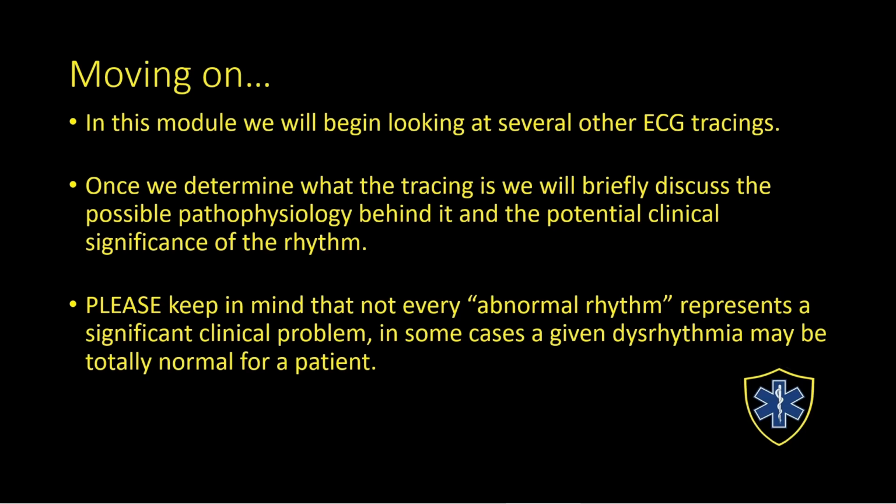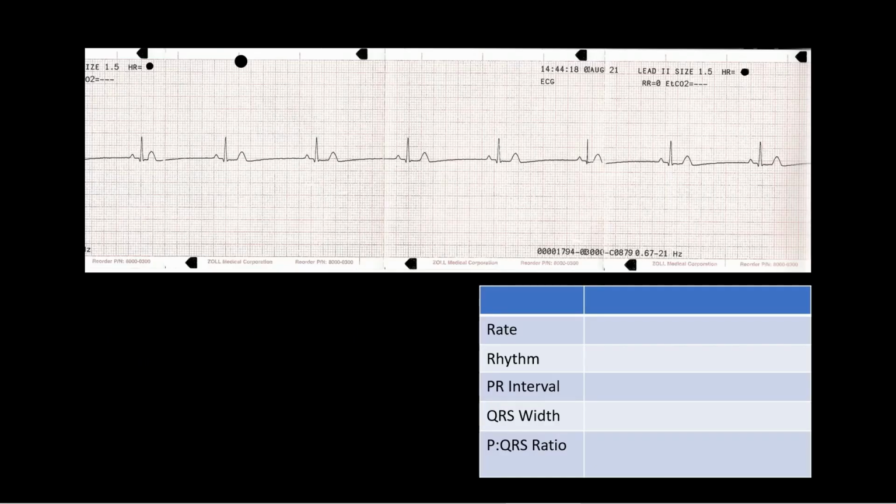Alrighty, now let's dig into some rhythms. We look at our first rhythm there, and the first thing we want to do is, again, look at our rate. Now, there are several ways we can determine what the rate would be on this rhythm.